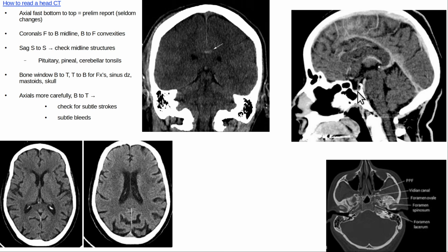The only real difference I can see between the brain of a man and a woman that's obviously visible is that premenopausal females got big pituitaries. It has a convex, upward projecting margin on the top. Men have smaller pituitaries, often a flat top, so to speak, or even a concave top.